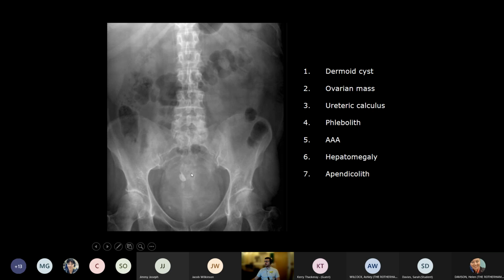So we did some further imaging and it turned out to be a dermoid cyst. Often these patients present with these calcifications, and they'll end up being things like tooth formation within the tumor. So this is a benign tumor, called a dermoid cyst. The outer aspect of it you probably struggle to see, but this is the calcified component within.